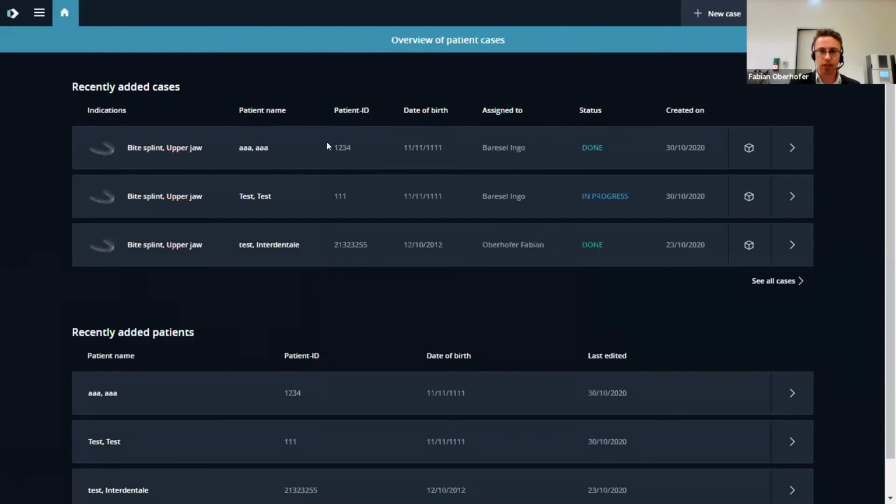This is our case from now. Status is done. For example, this one is not finished, so it's still in progress. And if I have a look here on my printer, I can see there's one print job in line, which is on hold. And now I will stop this, and we will go to the other camera. I will stop this, but I hope you still hear me.